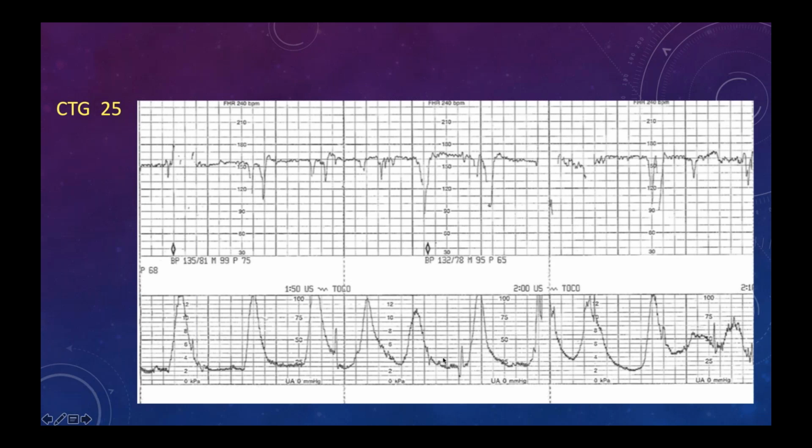No, ma'am, you can see 210, 180, then this is 150, this is 180. Okay, 160. Then this is near 155 to 160. And there is no acceleration.